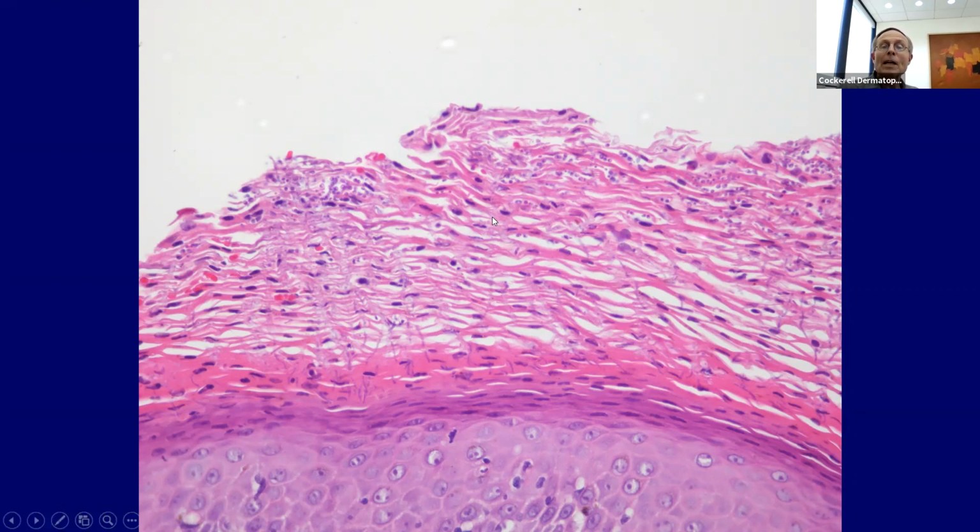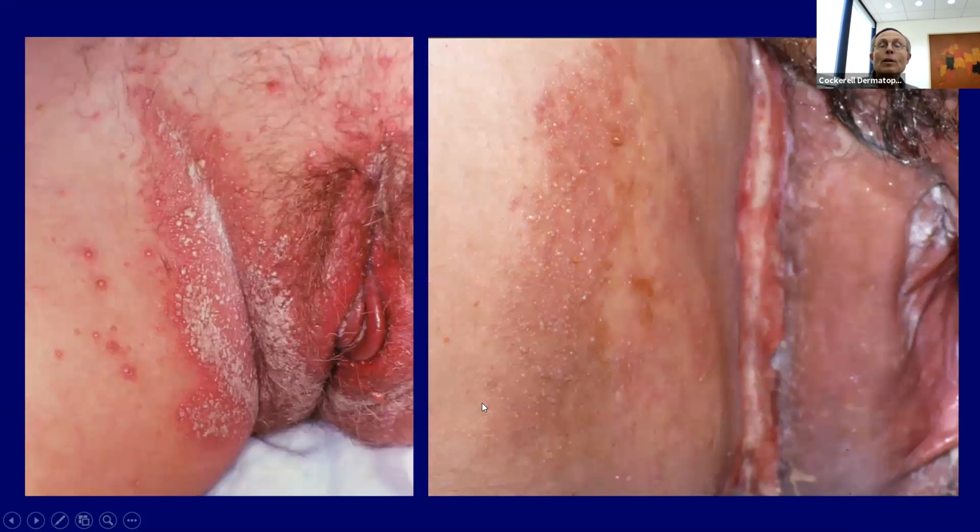And notice the organisms, they're drilling down. They're like drilling for oil here. They're going down from the cornified layer, which often in mucous membranes may not even be there, and they're trying to get into the epithelium. So dermatophytosis likes to go side to side, horizontal, sandwich sign. This thing likes to zoom down into your skin, and this one even had some yeast here as well. And so these are pseudohyphae, and you'll get pustules with this process.